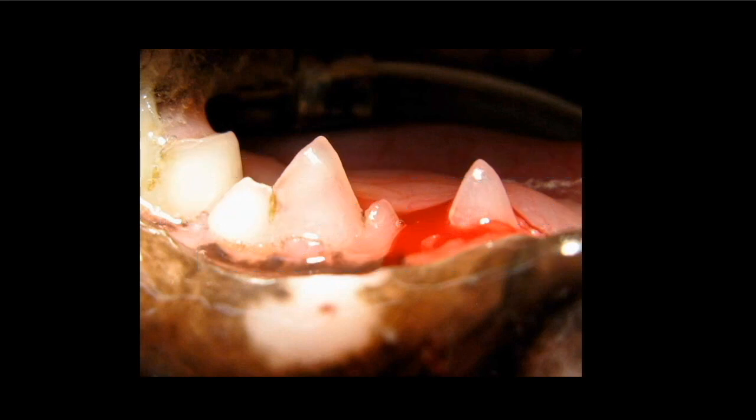Moving on, let's talk briefly about something else that's really, really common as a case example, and that is tooth resorption in cats. So we've got this image. Take a look at that. Look at those two teeth that you can see. There's obvious changes there, with the bleeding on that third premolar, the one on the right side. The fourth premolar, you have to look really close to see the changes on that. But take a look at that, see what you think, and then I'm going to show you the radiograph.